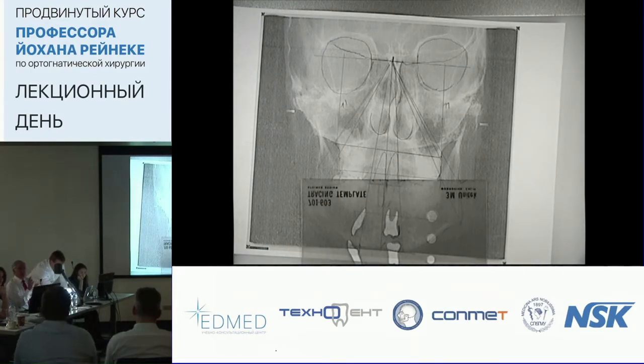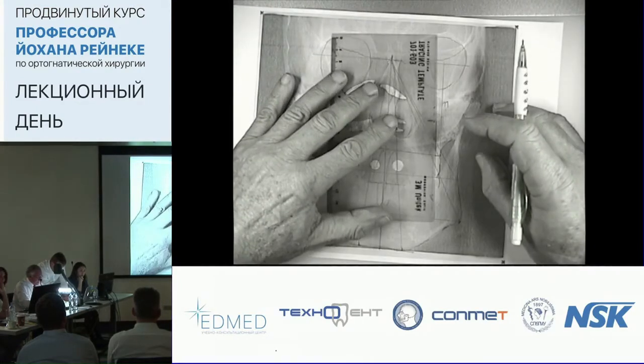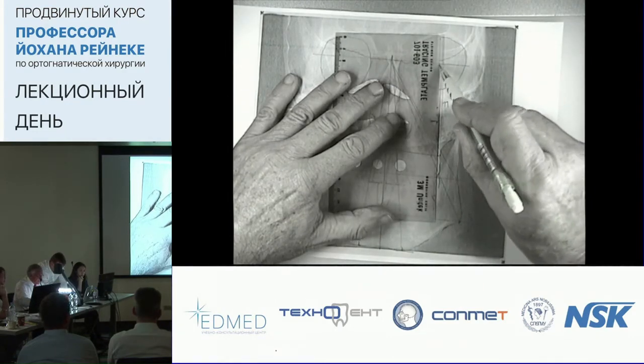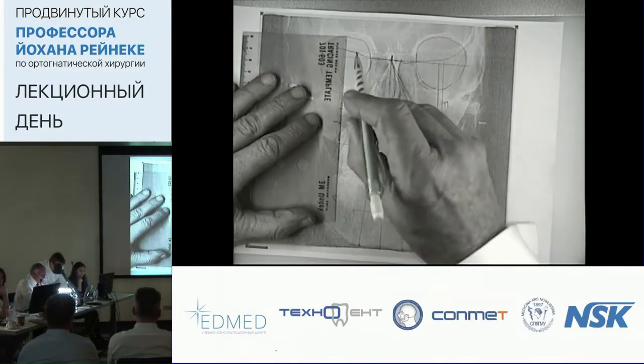And at the time when we do the surgery, the contact point in the maxilla up there, we need to move it across, off the contact point, a little bit to the left. So I would now decide, there's a big difference skeletally, but dentally, I can't see the teeth that very well, but I can now see what's the discrepancy, and I can also measure that on my models.